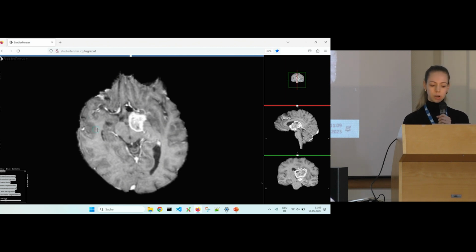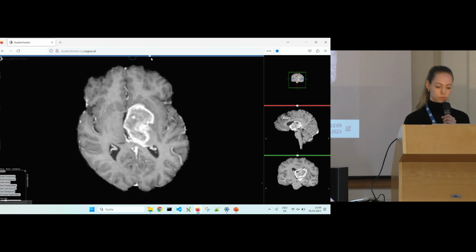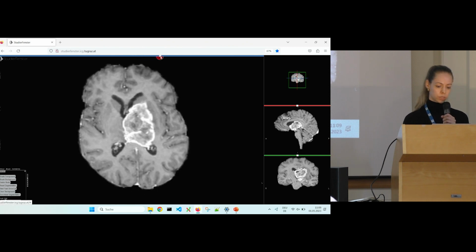Okay, so this is an MRI head scan with a brain tumor that we're going to segment in this example. So let's first select the plane that we want to segment. Maybe this one. I already selected something here that was unintentional, so let me reset it. Okay, so we will select foreground regions and background regions now. So let's start right away with the foreground. I want to select the brain tumor, then the background in a different color. I'll just go around it, make sure as much as possible is included.